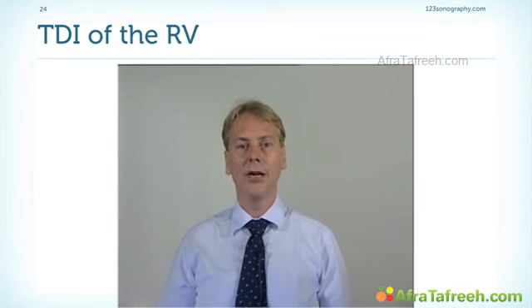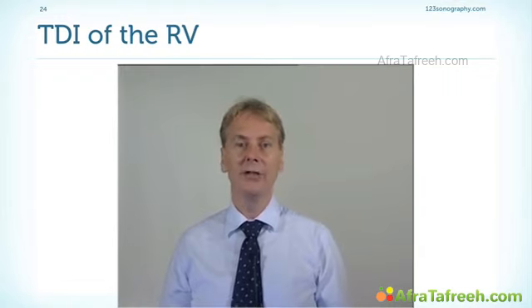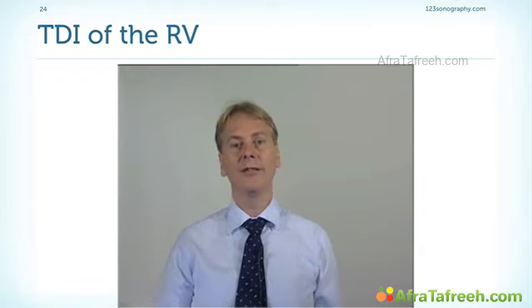But tissue Doppler can not only be used for the mitral annulus, it can also be used for the myocardium, and I find it specifically valuable to assess right ventricular function.